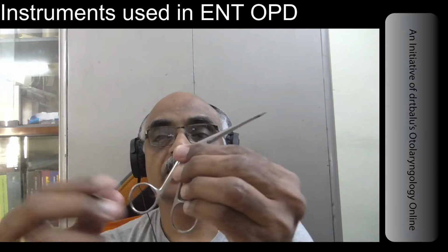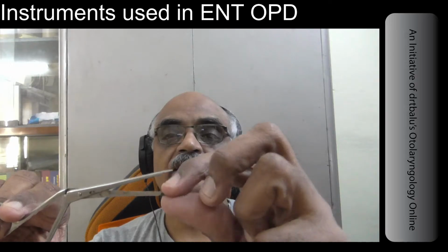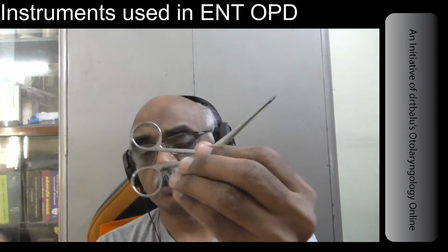The next instrument I'm going to show you is a Hartmann's forceps, Hartmann's ear forceps. This is more or less designed like a crocodile jaw, and there are serrations here. The serrations ensure that a cotton ball can be held by this forceps without the fear of any slippage. So you can pack the ear with a cotton ball using this forceps. You can use the same forceps to pack the nasal cavity or remove a foreign body inside the nasal cavity. But I personally would use this instrument only for inserting a cotton ball inside the ear.